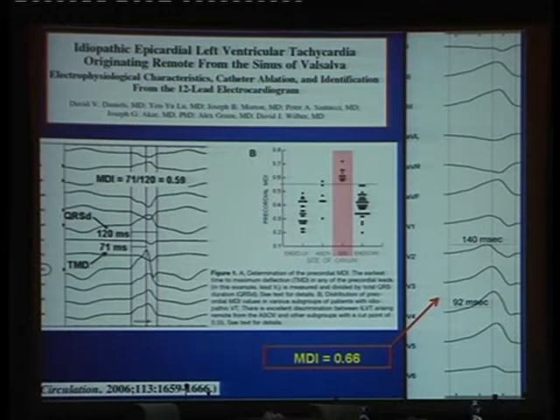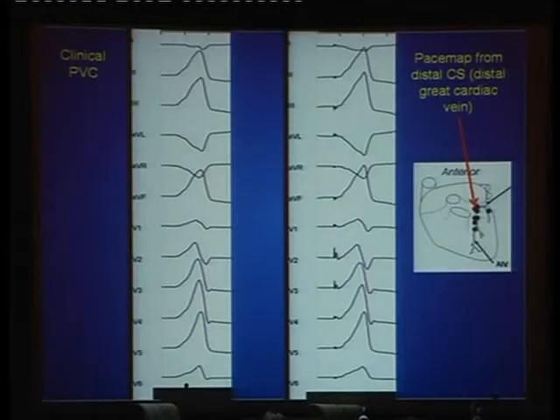So when you've mapped the endocardium and you haven't found a good site, analyzing the ECG is going to take you a bit more quickly to the epicardial surface. And this is a pace map from the epicardial surface on this particular patient done by my colleague Pablo Neri, showing a pretty darn good match on the epicardium when they found nothing on the endocardium that was good.